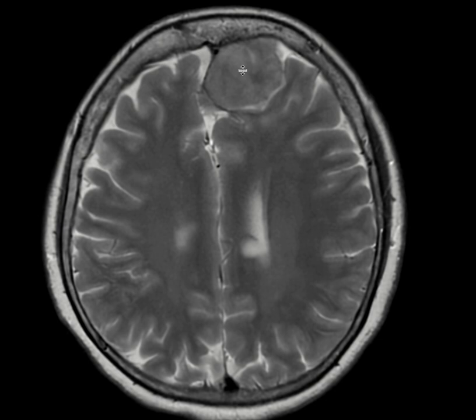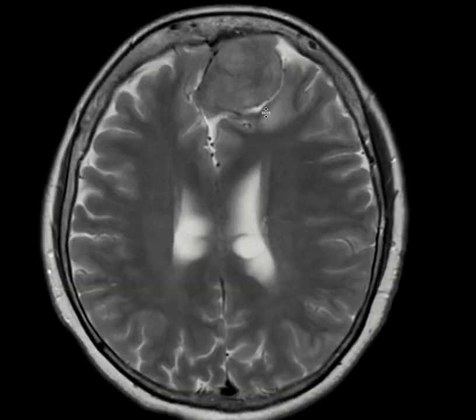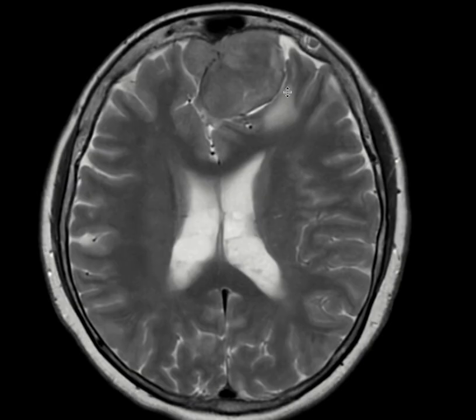So first of all, you need to say, is it intra-axial or extra-axial? And then you have to come up with a differential. Is it a benign or malignant entity? So as I said, based on all these things that we discussed, this looks like an extra-axial mass, because we have a CSF cleft, we have all this displacement, and we have this cortex that is separating the mass from the underlying parenchyma. And then we see something weird: in the white matter, we have some abnormal white matter signal. This is because we have another lesion here.